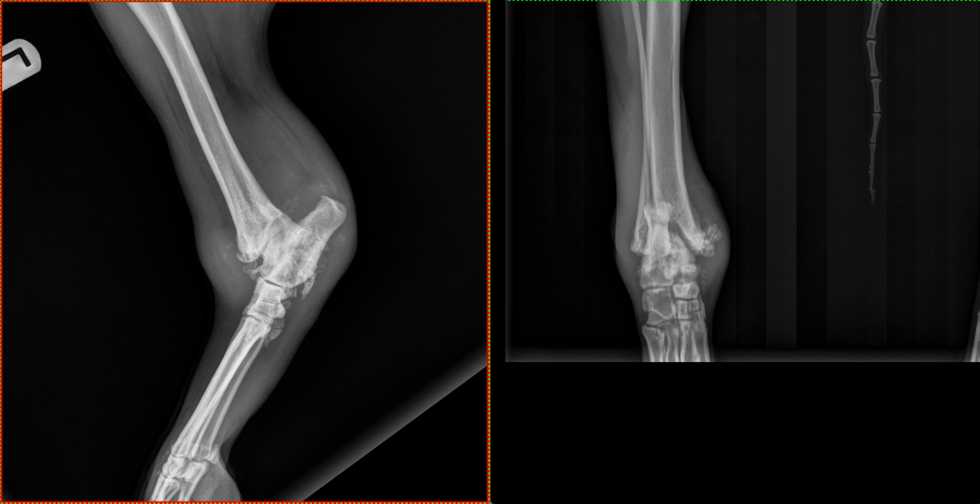So this is consistent with a large volume of effusion. However, this is probably more severe than what was observed in the right stifle. There are multiple mineral foci superimposed within this space as well, so likely within the capsule or along the capsular margins.